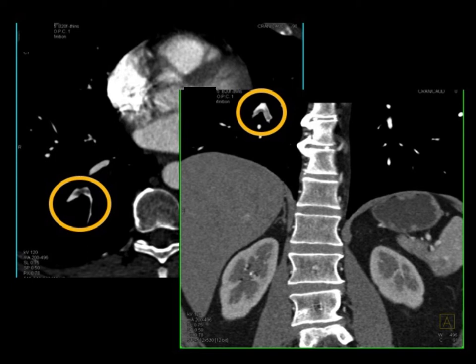all the questions. If I need to favor one part of the study, I'll favor the part that involves the coronary arteries. You have a little bit more leeway in looking at the pulmonary arteries and, of course, more leeway in looking at the aorta. But if the coronary arteries are not good, you're going to have a problem. And so in this case, very nice example showing you the patient's pulmonary emboli nicely seen.